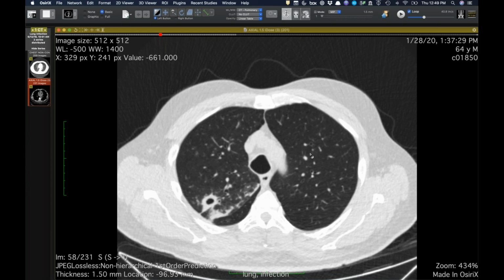The infection travels downward with gravity, I think, but I think it's first acquired in this location. So I've seen a number of them early in this region, even in those slender little old ladies. And so I think if you catch it early, it's often in this region. With chronicity, it's more likely to involve those middle lobe and lingular regions.